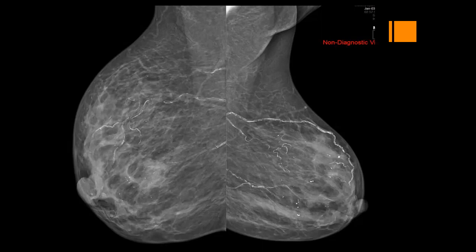This is not rod-like calcification. Not like rod calcification, because rod calcification goes to the nipple, but there is some area of abnormality in this calcification, not like plasma cell mastitis that radiates to the nipple. Okay, what else? Excellent, well done, Suhair.